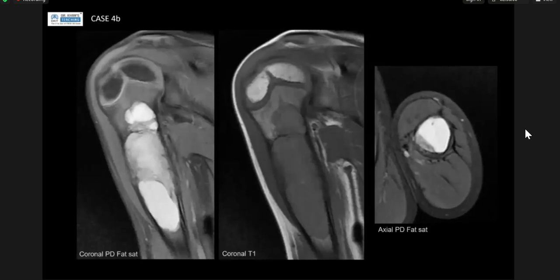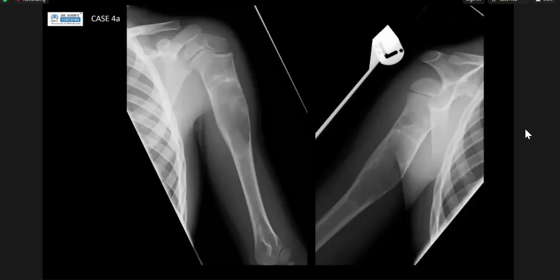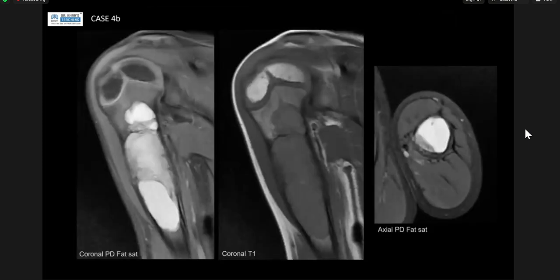The key features are, I guess, that it's intramedullary. The one that I've shown you has actually fractured before, which is why you're seeing it on the plain film. You can see on the lateral cortex that it's fractured before within the proximal part of the lesion, and that's why I think it gives that kind of fibrous dysplasia appearance.